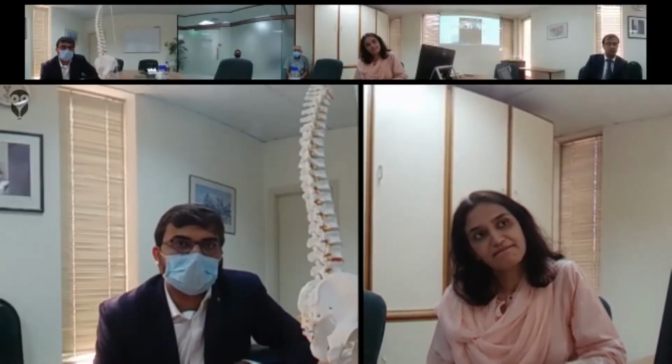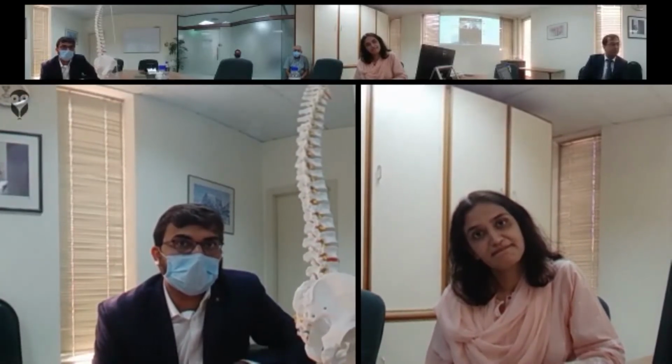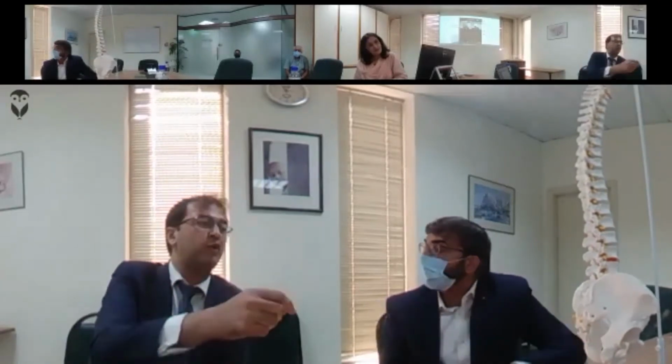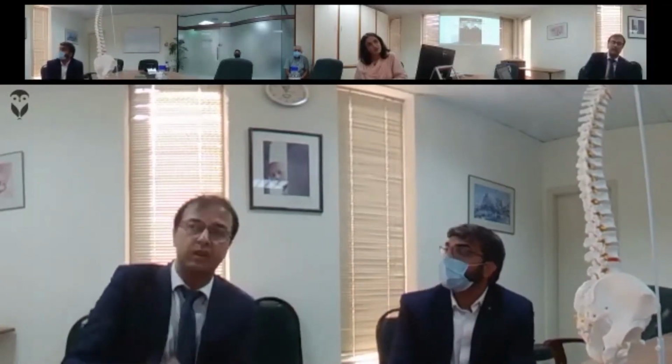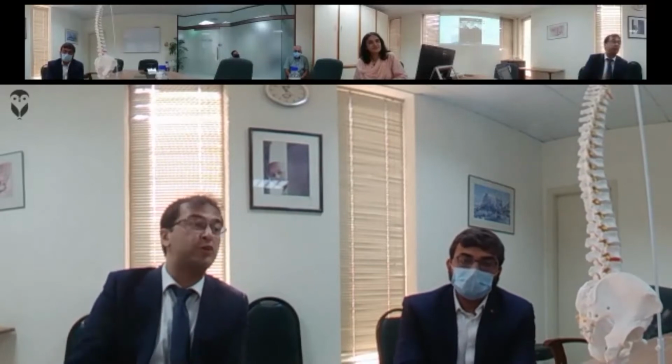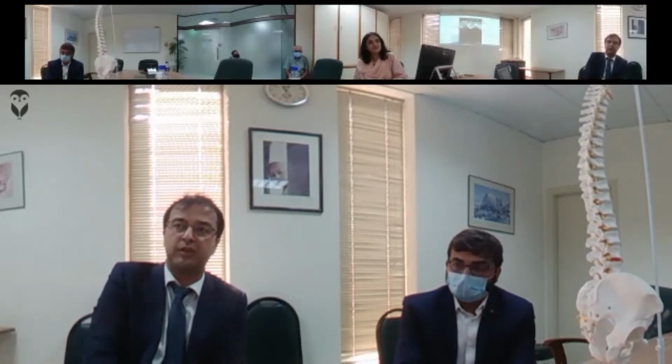Generally, yes. If the patient simply has spinal stenosis with both side leg pains, it may be an interlaminar epidural. Yes, it has its place. It has its place when it's widespread. Absolutely. I was talking more in terms of when you know it's very precise, just one level. Then from a diagnostic point of view as well, and for future implications, doing a precise nerve root for future consideration of pulse radiofrequency of that sort.